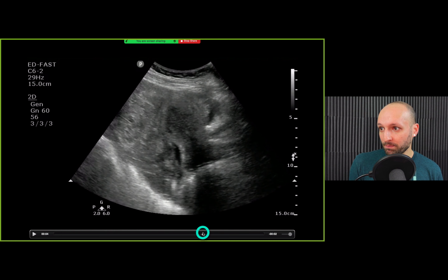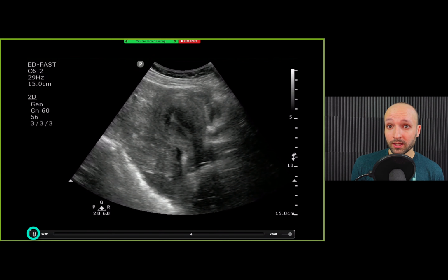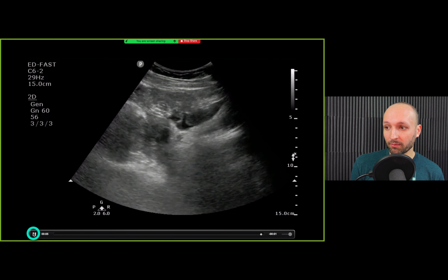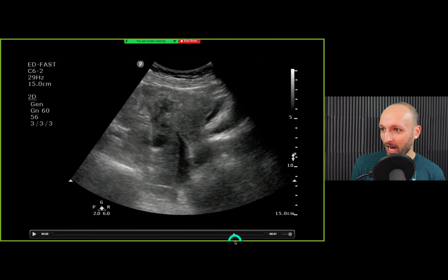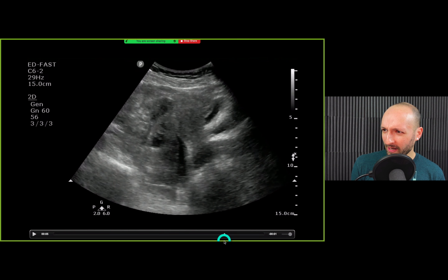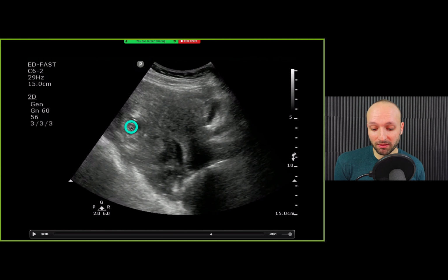Now, this is a different patient from that previous one. I see the uterus here, going into the vaginal canal, and I see a bunch of clot with a little bit of free fluid down here. It's very important when you're looking at a patient with acute abdominal pain to not confuse clot for bowel. It's something that can happen if you're not paying attention. Right about here, that's the gestational sac on this other ectopic pregnancy. So be very careful on these.